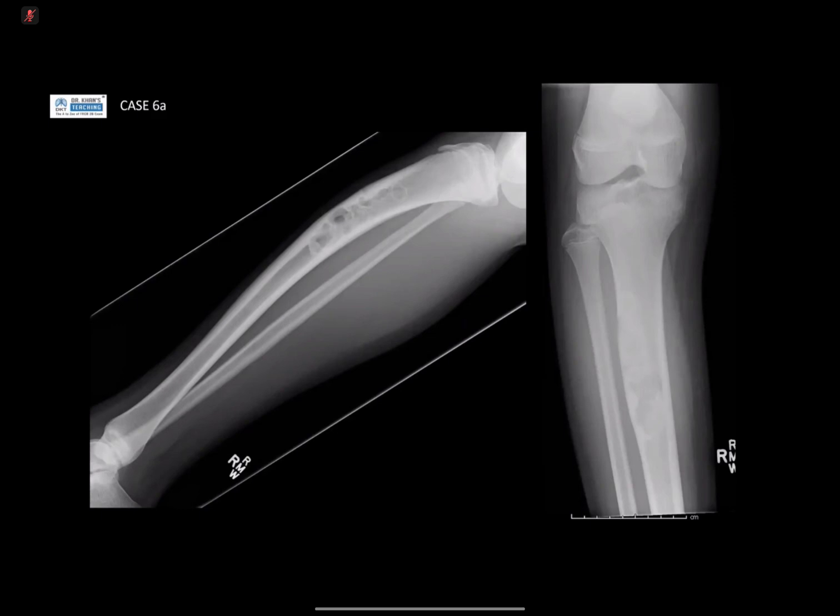Does the patient have a fever? So I would put infective etiology as the first differential. Did you say infection? Brodie's abscess. Okay. Is this a typical location for infection? No, it is not. And where would you tend to see infection or Brodie's abscess? It would be more in the tibial metaphyseal, distal tibial metaphyseal or proximal region.